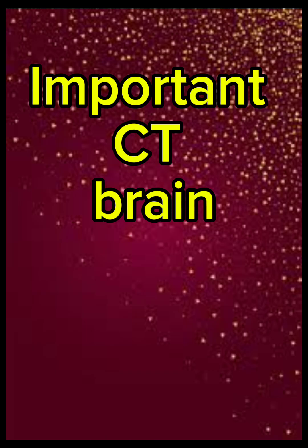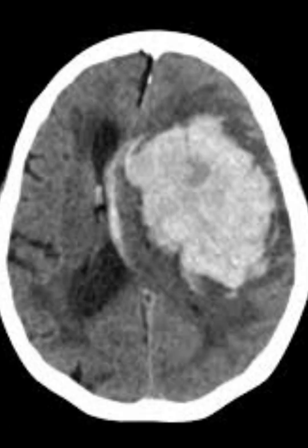Now the important CT brain. This is a CT brain of intracerebral hemorrhage which is big, and it is white in color and surrounded by gray cerebral edema, and this hemorrhage and cerebral edema is shifting the midline. The midline is being shifted.